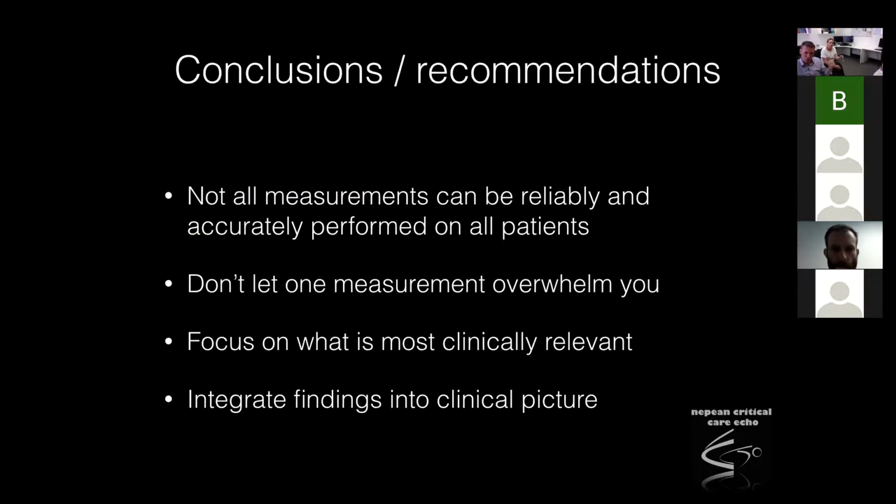So good. So we'll go through one quick case. So let's just remember that we want to do measurements because it helps our communication. They should be a part of every routine full study, measuring, or at least subjectively assessing ejection fraction and LV size and function. Know your walls. When you're trying to make assessments of things like LV systolic function, don't just rely on one image or one measurement. You've got to, as I describe it, see the whole heart.